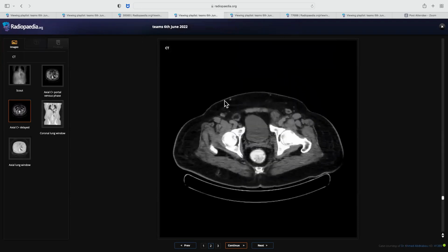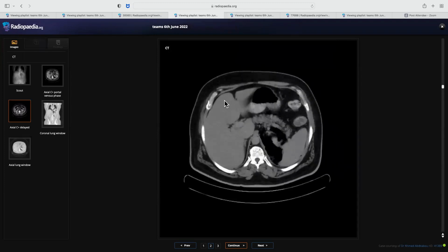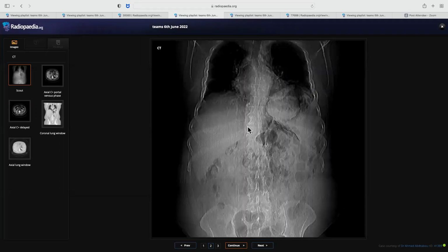This one you very correctly said pneumoretroperitoneum, and the cause was retroperitoneal abscess. As you couldn't see any other cause, I was asking about the causes of pneumoretroperitoneum. First of all, I would want to say one thing, once you saw the scout. Here the entire series is there. In the exam, we don't even know whether they have the series with them. We just see the scout.